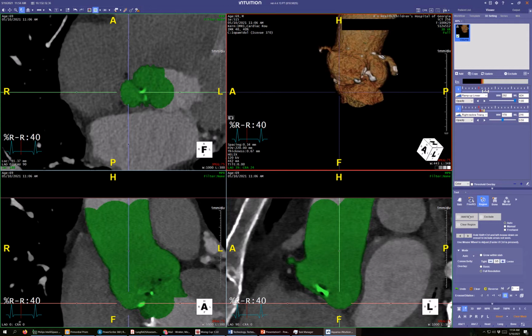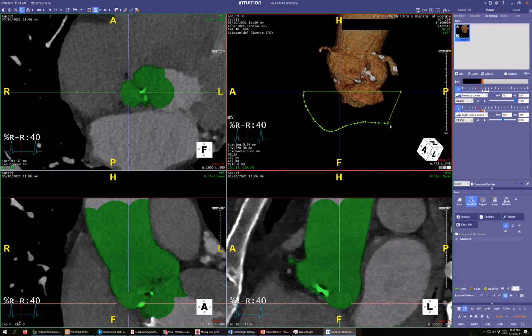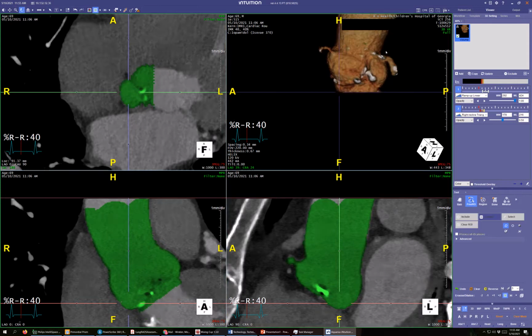just trim it so it looks nice. You know, my rule has always been no ugly pictures. It's got to be pretty if it comes out of the lab. So here, I'm doing a freehand region of interest. I held down the shift key and placed all those dots, and now I'm going to just hit exclude.